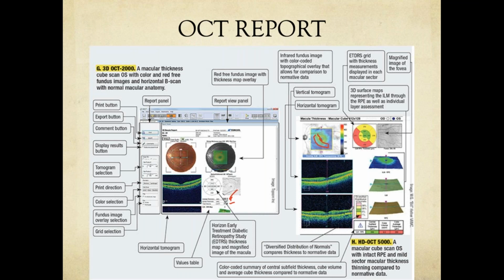And even when the retina is so much affected, if this was caused by diabetes, and if that diabetic eye had this much macular edema, the thickness would not be as illustrated here. The thickness would be much, much greater, and we would probably be mapping this retina around 400 to 500 between the yellow and the red.